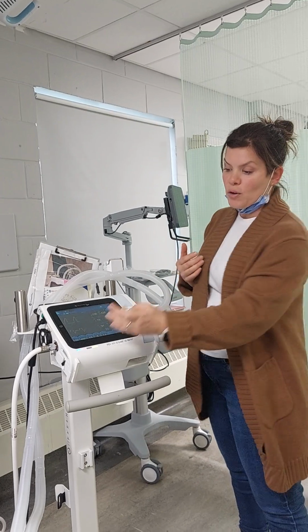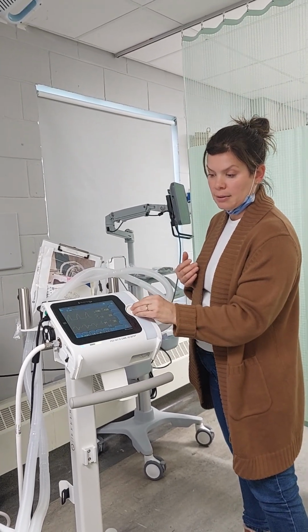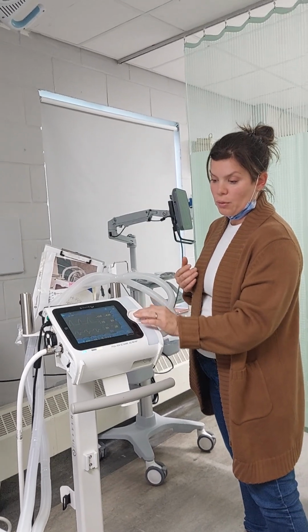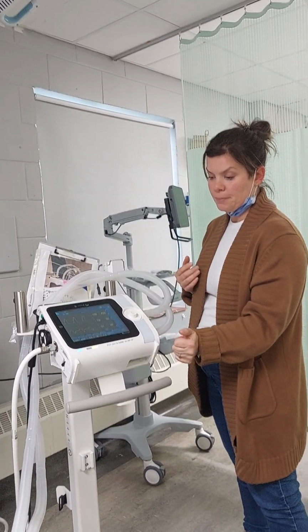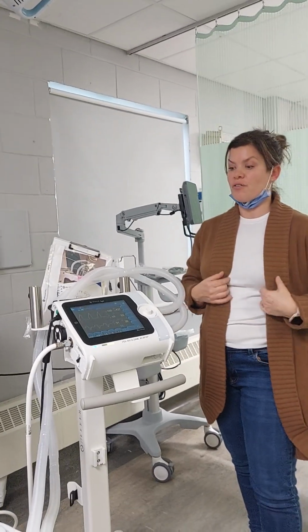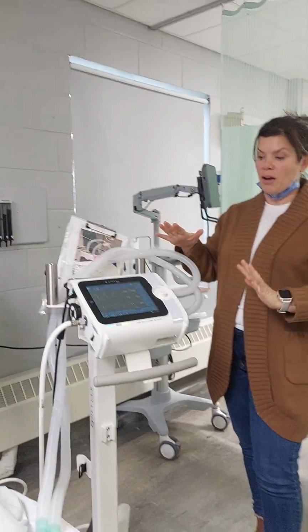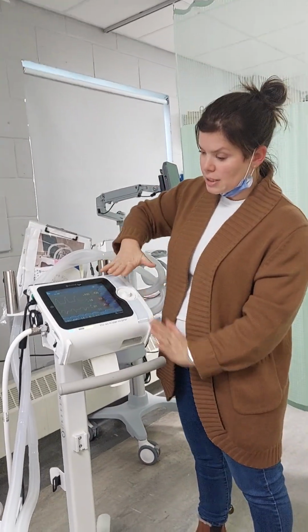And then everything from there, you've got some time. If you want to change anything, you're pushing a button and just dialing. It's very straightforward, very user-friendly. We are not RTs, but we can call one if we need to. And you can always call one. They're very helpful. Okay, so does that make sense?